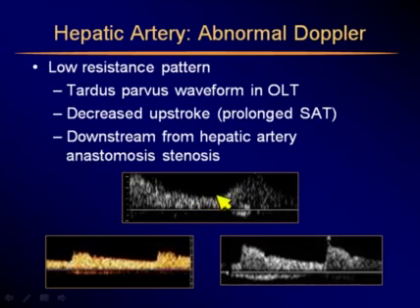We would see low upstroke and fairly low velocity, which means that proportionately the diastolic flow is elevated. So we have a prolonged systolic acceleration time and then this tardus parvus waveform. What it means is that there is a hepatic artery stenosis, an anastomotic stenosis post-operatively.